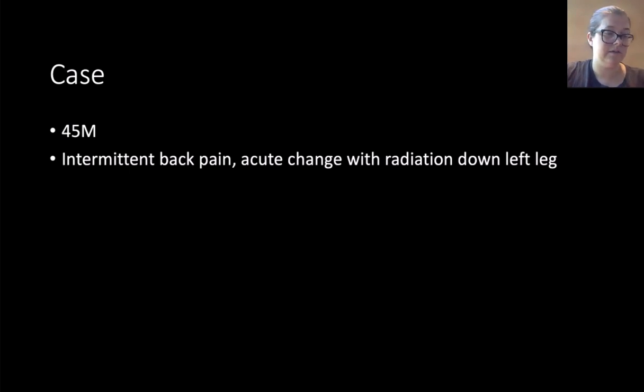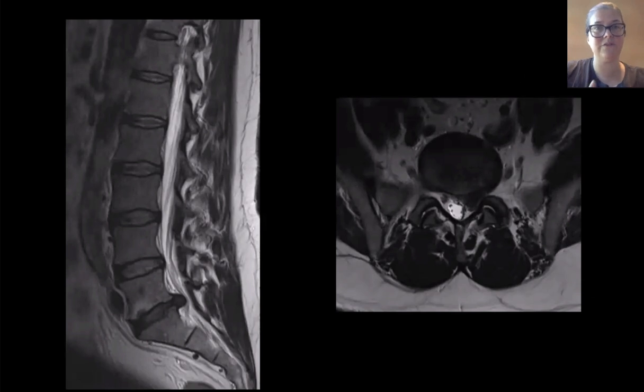Okay, so let's just go through a few cases now that we've got our nomenclature down, or at least we know what the different grading systems are and we're going to decide which we use. Let's just go through a few cases. So this is the first case that we had.